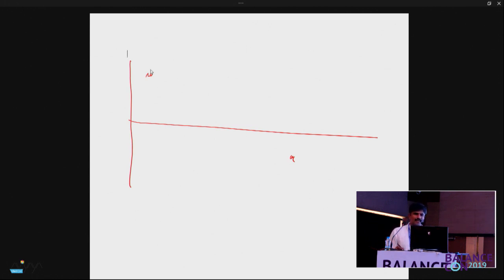So when the eye is here, it means the eye is looking to the right side. When the eye is looking to the right side, you see the eye movement like this? So which side beating is this? Left beating? Yes, sir. So this was left beating. Anybody else needs explanation? Fine.